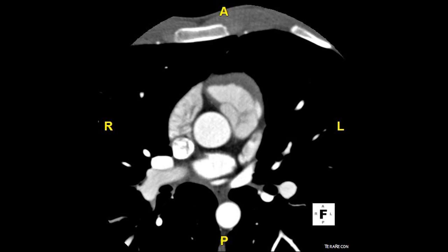This is the first of the two high-yield images I mentioned in the beginning of the presentation. Here is a new structure where the pulmonary trunk used to be, and I'll circle that in orange. And then another structure close to the superior vena cava, and I'll outline that in blue. Keeping in mind the flow of blood through the heart, what chambers are connected to those vessels?